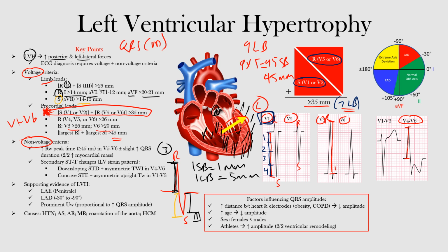So what is our intrinsicoid deflection? Do you remember? Let's just erase some of this so we can have some room. There's a lot going on here. Okay, here's our QRS complex.